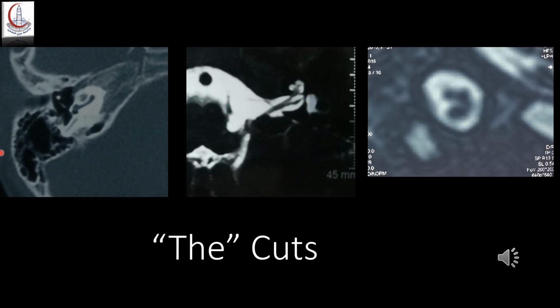This is an axial CT scan, which shows me the pneumatization of the mastoid, the pneumatization of the facial recess, the configuration of the round window, and the anatomical configuration of the cochlea. The second cut is the MRI T2 axial segment. This shows me the configuration of the vestibulocochlear nerve, the cochlear nerve, the configuration of the cochlea, and the permeability of the cochlear scale.